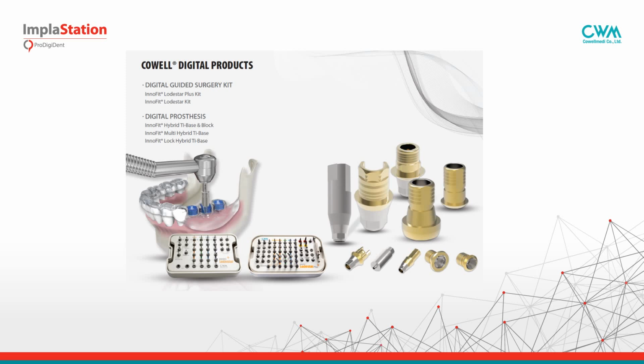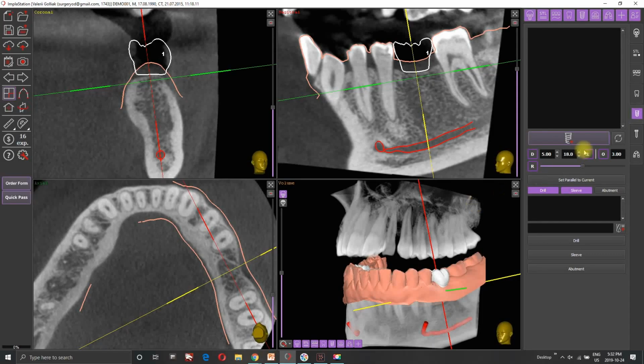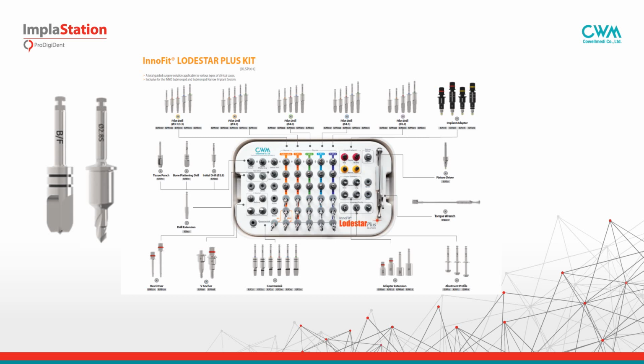The hardware part of the digital solution from Cowellive: drilling kits and a full range of the appropriate prosthetic elements. There are two kits, Lodestar and Lodestar Plus. Both of them are implemented in the ImplaStation library. I'd like just to pay your attention that it is extremely important to follow drilling protocols. I mean, every time start drilling from flattening and cortical drills.